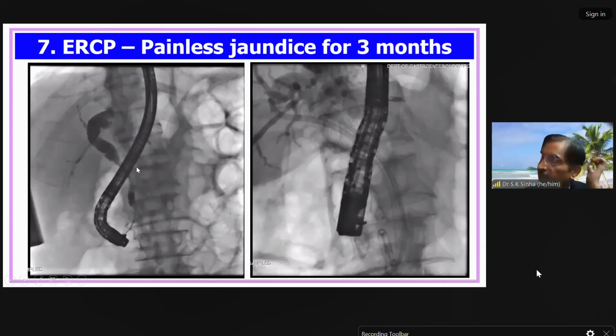This marks the first part of the duodenum. That is an intrapancreatic stricture. So again benign biliary stricture, most likely chronic pancreatitis, and here 2 stents have been placed and still you can see one guide wire. So possibly a third stent will also be placed.